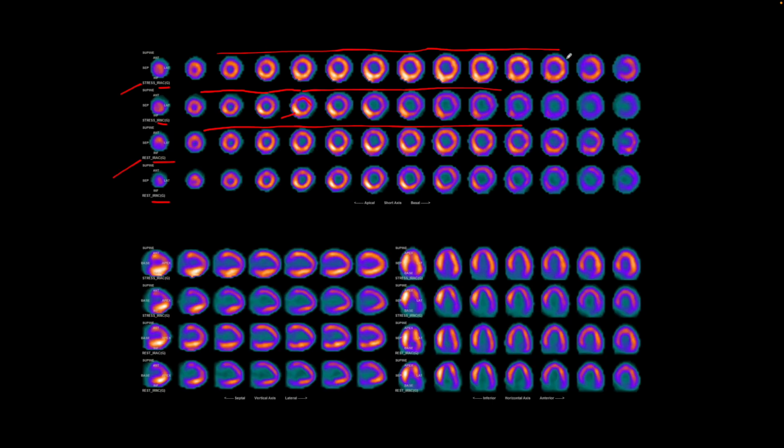Also, I would like to point out here that the ventricle is dilated. The end diastolic volume as calculated was elevated. Also, the ventricle appears hypertrophic. There is thickened, the septum and the lateral wall appear thickened.